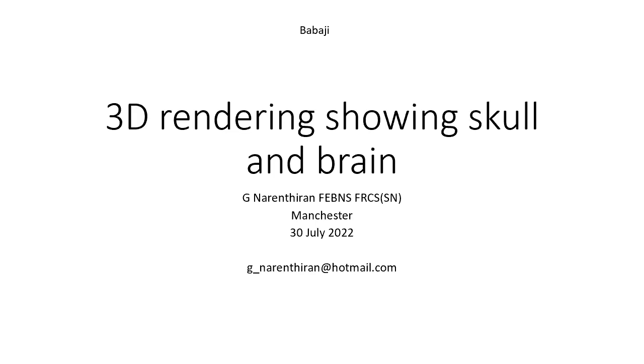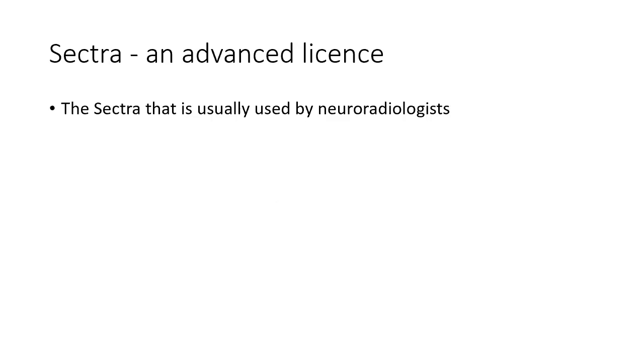So now let's go to the next slide. Just to reiterate, this is not the standard SECTRA. This is the advanced version of the SECTRA that the neuroradiologists use, that I used to do this rendering.